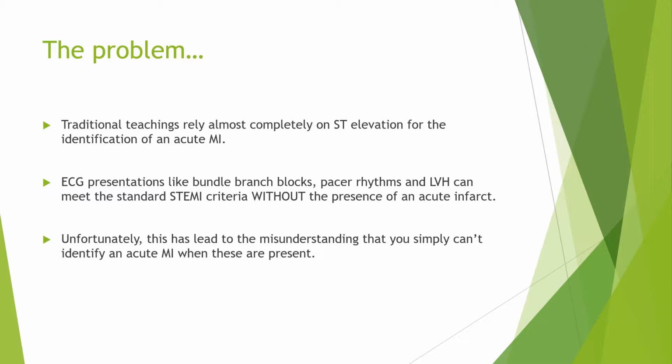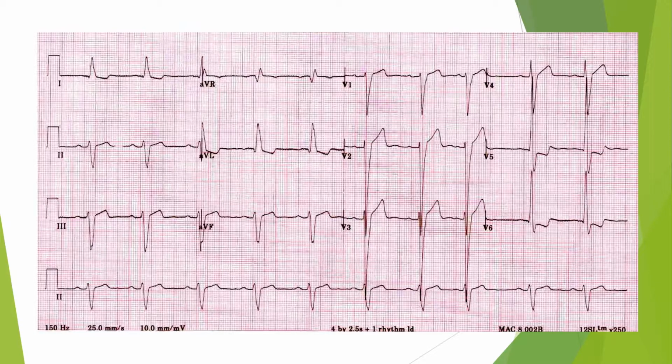Upwards of 20 to 30% of acute MIs actually present without these textbook STEMI criteria that we're taught. And I don't know about you guys, but I would prefer not to miss 2 out of 10 STEMIs, or acute MIs, I should say.